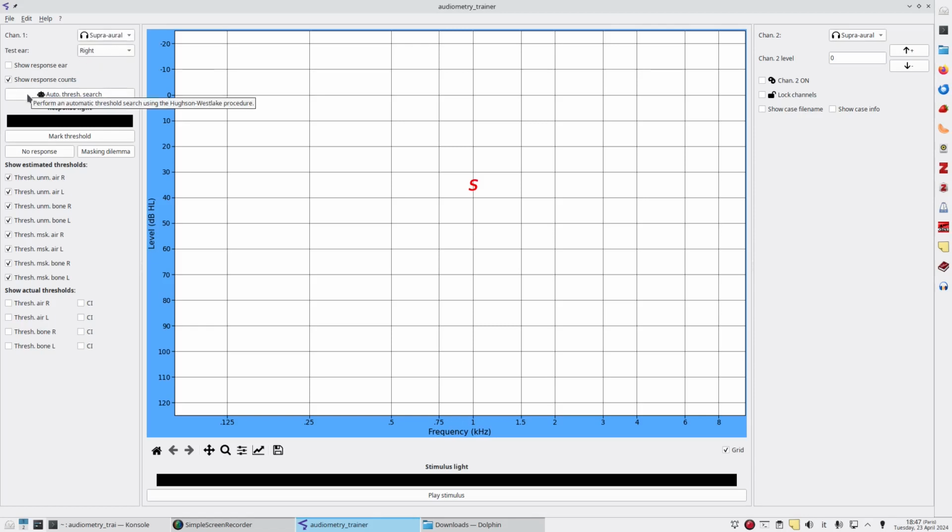And you should note that the interaural attenuation will change depending on the transducers that you choose. For example, insert earphones will generally have a greater interaural attenuation than supraural earphones. To add realism to the simulation, the interaural attenuation values are also frequency dependent, and they're not the same for each patient. As in real life, different virtual patients may have somewhat different interaural attenuation values, and these values for each patient are based on the range of interaural attenuation values published in the research literature.